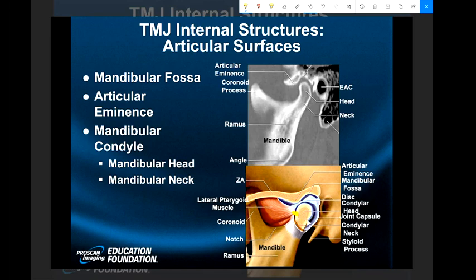Behind the mandibular condyle is the styloid process. Although not shown, a suture or fissure comes down here, known as the squamotympanic fissure or suture, part of the squamopetrosal group of sutures or fissures.